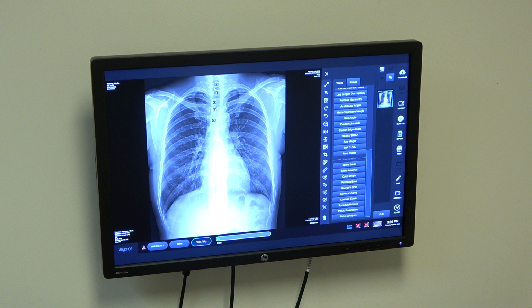So obviously this is typically done on a lateral C spine. We'll just say this was C1. You click there, and then it says click on the lower end of the last vertebral body in the C spine, which would be right here. And this would give you what the normal curve would be. So it's very nice how each of the tools, and especially as you get into something like the pelvic analysis, and the veterinarian vertebral heart assessment, all those tools have multiple steps that you have to take, but it's really nice. They give you the individual step-by-step instructions down here.